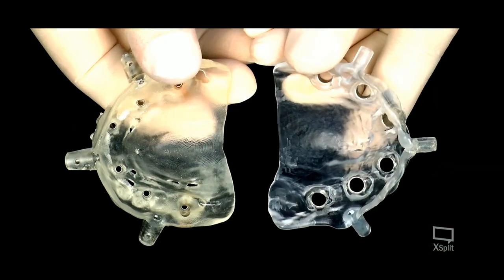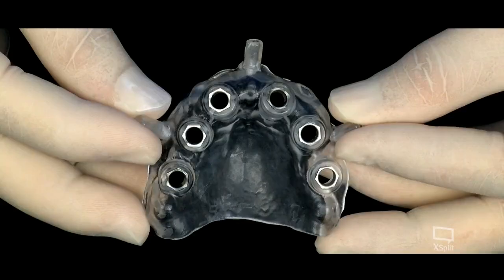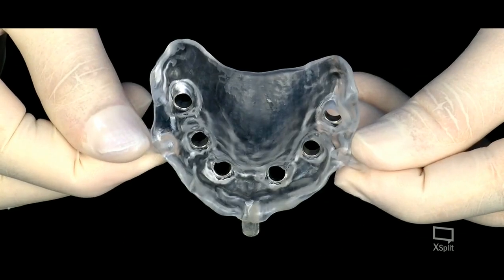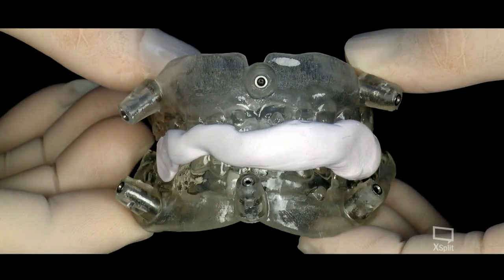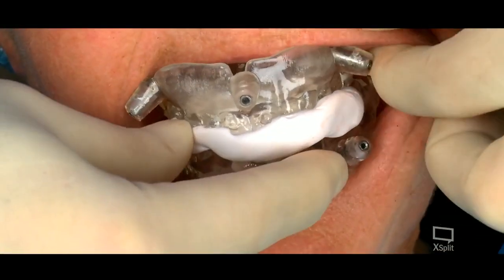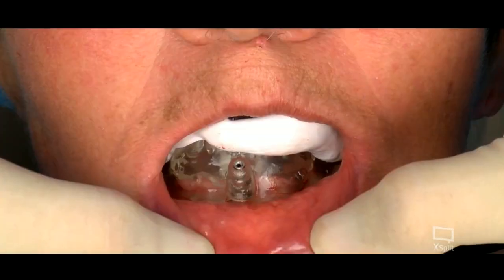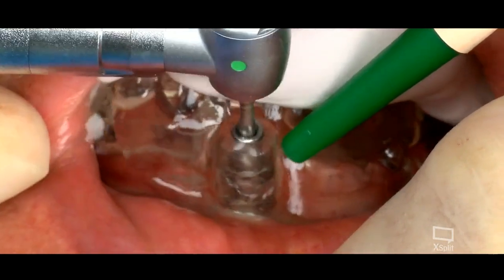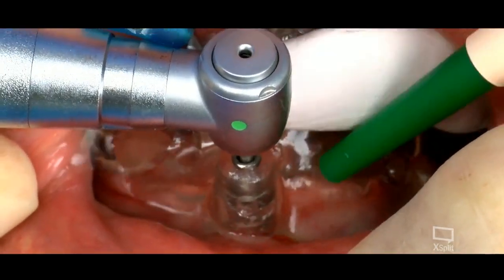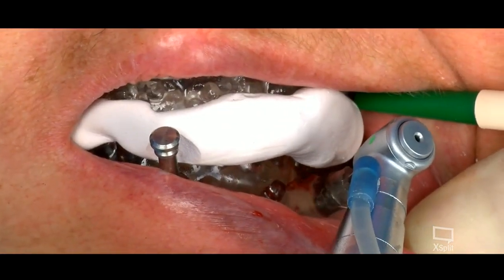So that's the problem. You see the surgery guide here, the Miller surgery guide, and you can also use this kind of bite. Once you have everything in the articulator, you can relate the upper and lower with the stop with resin, and you have the possibility to put it into the patient's mouth, upper and lower, really easily, and have a relation between upper and lower.